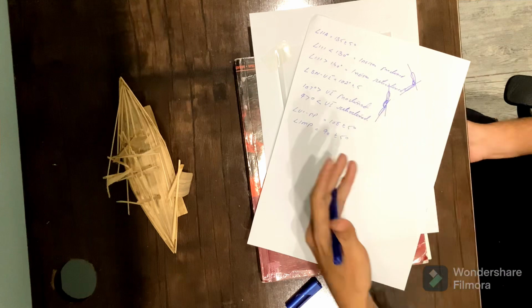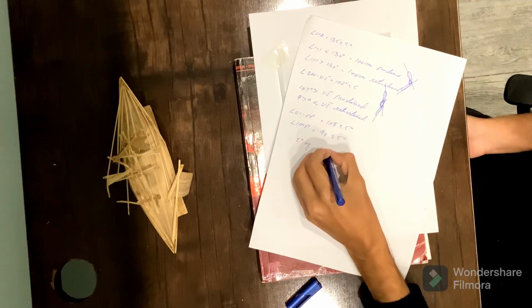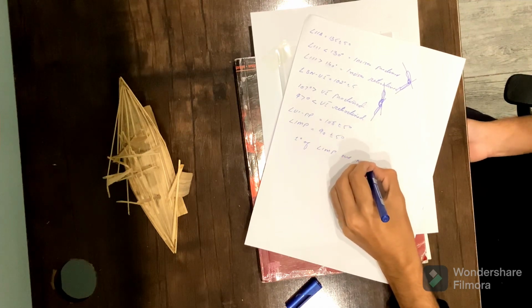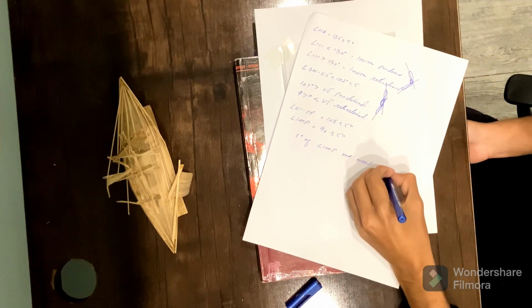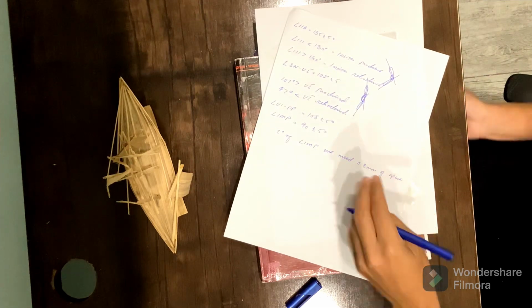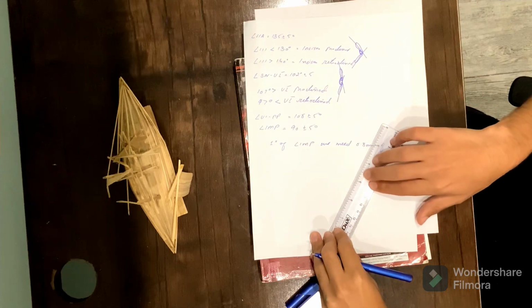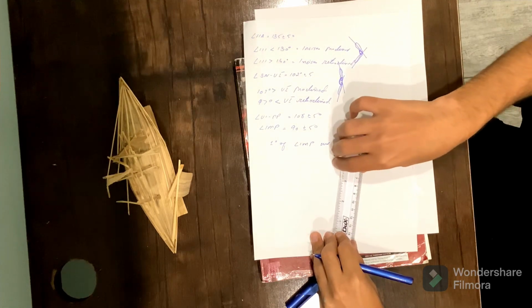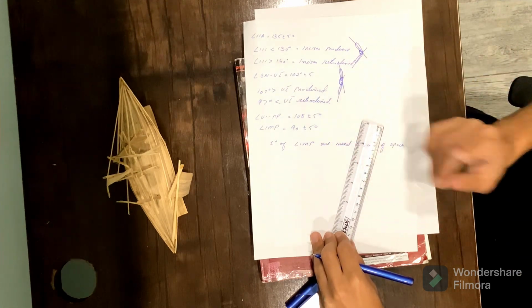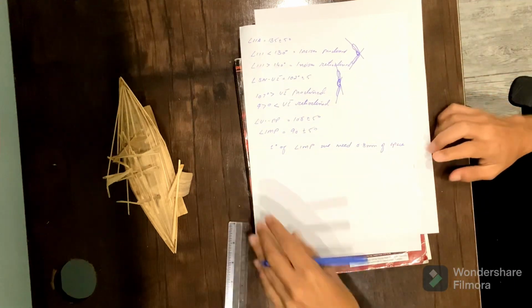In the case of crowding, for every 1 degree of incisor mandibular plane angle, we need 0.8 mm of space. So if the incisors are proclined and we have to take them back into their original position, to retrocline them by 1 degree, we need a space of 0.8 mm. Okay, next one.